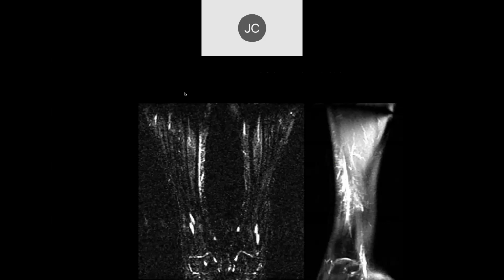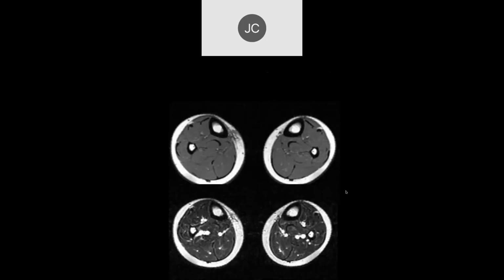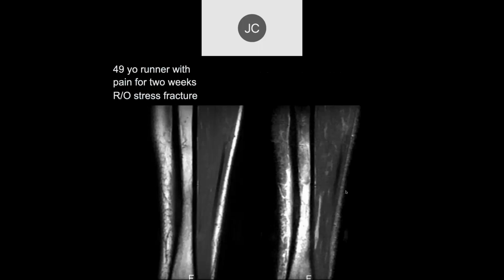Elliot, what do you think of this case? Okay, so we're looking at the distal leg. Yeah, this is a very old low field study. Maybe this is a vessel, maybe it's something. If you go to the axials... No, let's forget this case. Let's do this one.